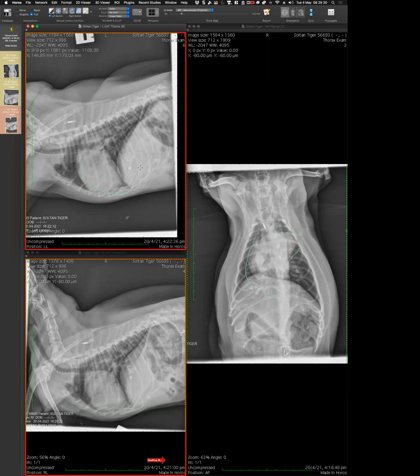Okay. I feel like this area here, which we have said there is some increased opacity there, but you can see the bronchi, makes me think it's alveolar. But then the fact that you have reduced opacity also overlying the heart, I can't explain. So I guess I'm interested in things that can cause enlargement here on the right outflow area, because even though it's rotated, I think that's a really strong finding. So I'm trying to think of things that can cause enlargement there in an old dog.